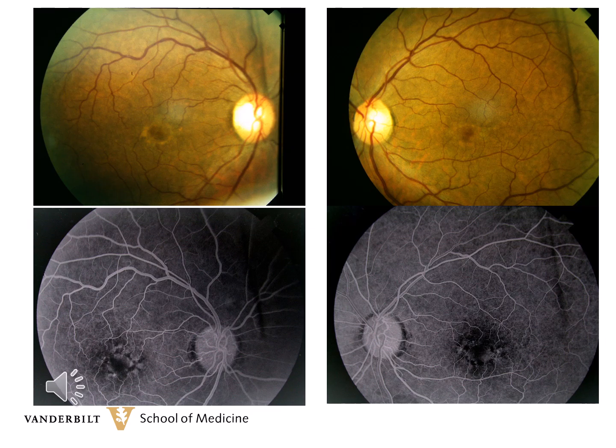Again, there's a central dark hypofluorescent area in each macula, and you can see some radiating hypofluorescent lines and some surrounding hyperfluorescent spokes. And again, this pattern of angiography is fairly typical that I've found of patients with pattern dystrophy.